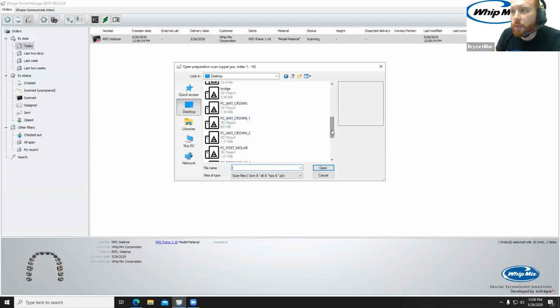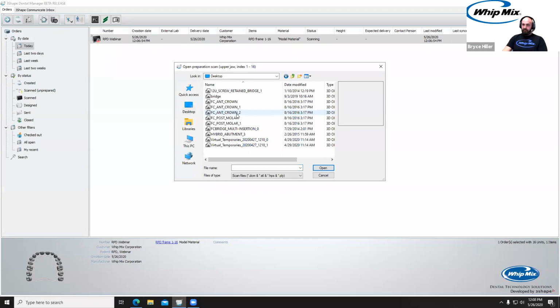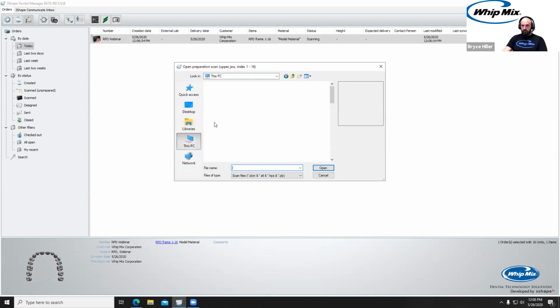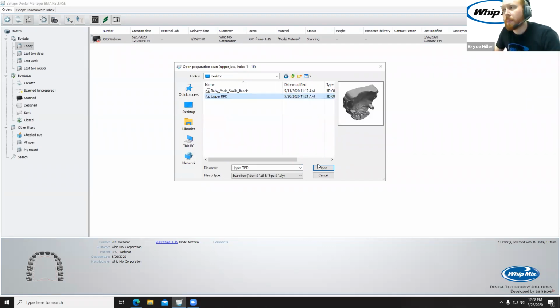Trying to find the demo case. I don't know why it's not showing. I believe we have demo cases on the Z drive. I've got a scan on my desktop. Why is it not... there it is. Got it. Okay, cool.